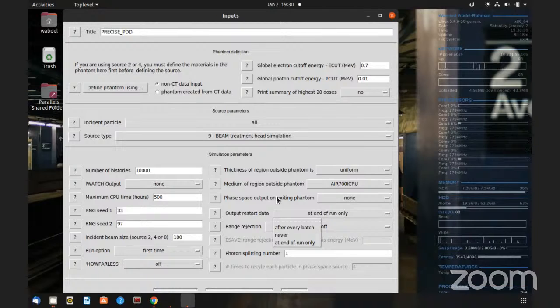But especially if you're using parallel processing, and especially like the case with Bilal and myself, where we mount through the network, if your data file is huge, then writing the results of the simulation after every batch is going to slow down your simulation. So the best thing is don't do it after every batch, but leave it at the end. When it finishes running the full simulation, then go and write the results to a file. That's it.